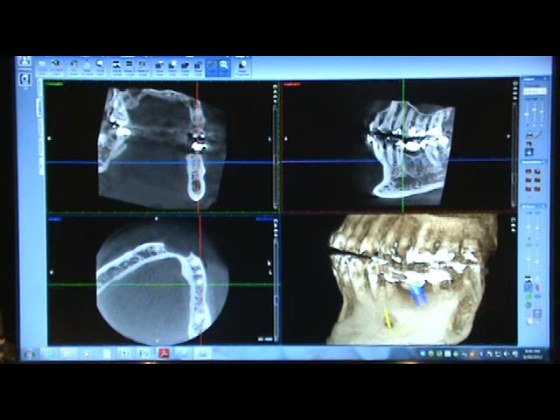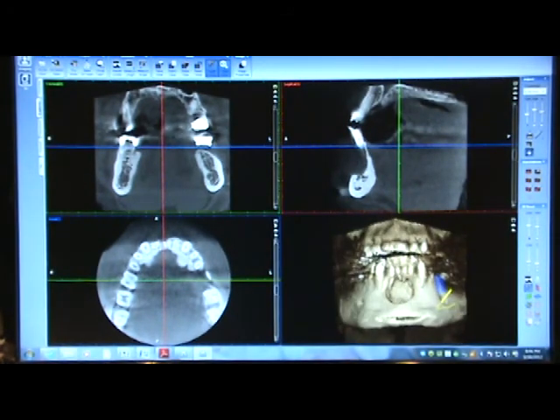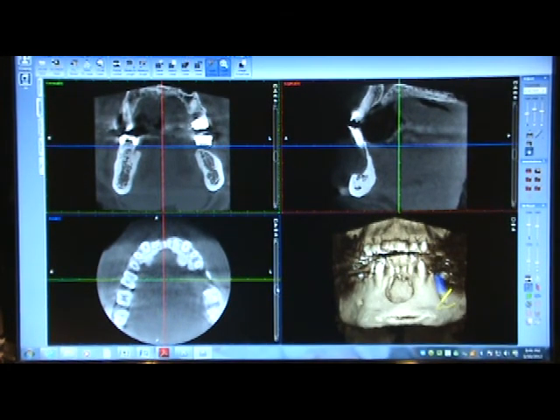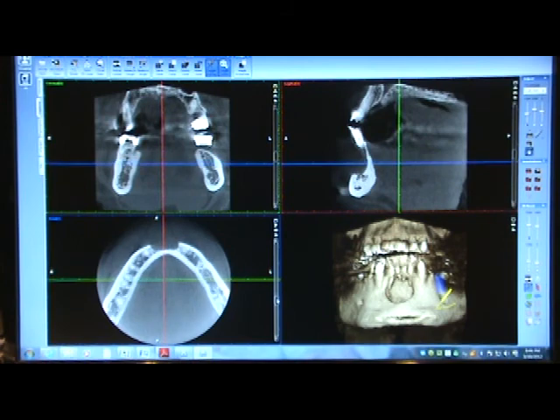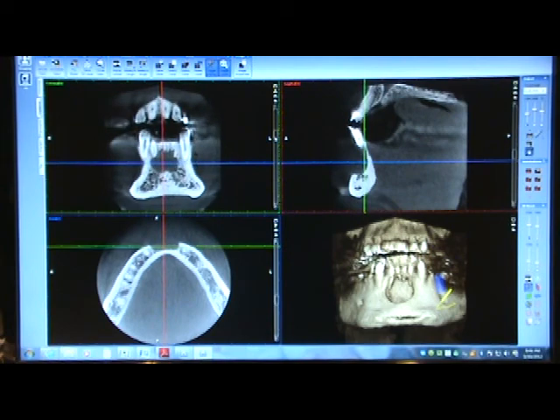Now, whenever you are confused or you're not sure of the view you have, there's the Reset View button. On the top, you click that, and that brings you back to your original orientation. Left click, slide down. Again, you can see the lesion also in the front. And there's lots of little fun gadgets.